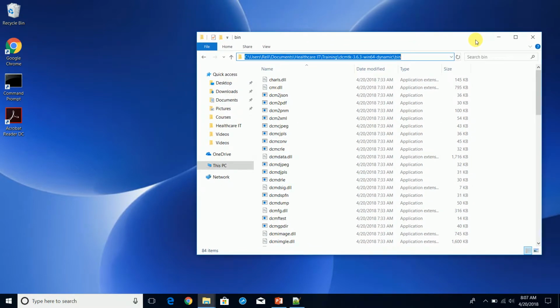This is going to be useful for you when you are interviewing for a position, or when you already have the job in healthcare IT as a PACS administrator or PACS analyst. You can let them know that you've performed training to where you know how to do a DICOM verify. I already know how to send images. I've already implemented parts of the DICOM standard.